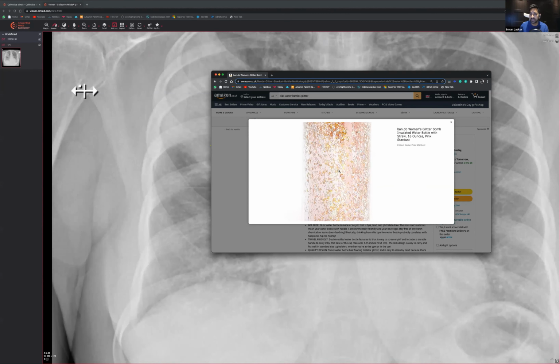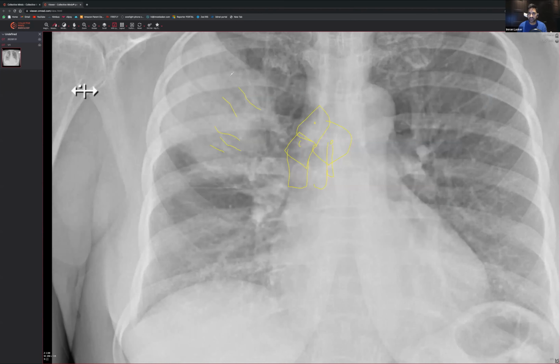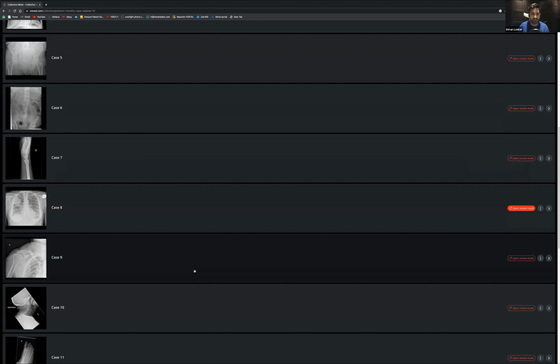And that's exactly what happens. So imagine that was like the lung. The straw is the bronchus, the bronchogram or the bronchiole. And so when it gets all full of pus and full of fluid, the straw doesn't get full, and neither does the air bronchogram, the actual bronchiole. That's why you get these radiolucencies, exactly like that. So just imagine tiny little bottles, and the little straw doesn't get full of fluid. Everything around it gets full of fluid. That's just a good way that I used to explain it to my registrars. But anyway, that's consolidation located within the right upper lung zone. That's how I would describe it.